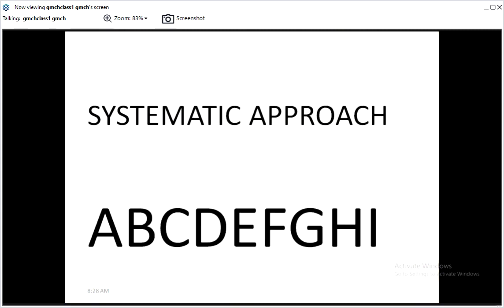So what we have seen in technical quality, there are three things. One is rotation, one is expansion, and one is penetration. So if these three things are fine, then you can give your interpretation of the X-ray with reasonable confidence. But if it is a rotated film, not well expanded, penetration is not fine, then you cannot comment whether the X-ray is having some abnormality or not. Okay. So coming further, these were the basic things which you have to do while describing every X-ray. Okay, technical quality and the basic details.